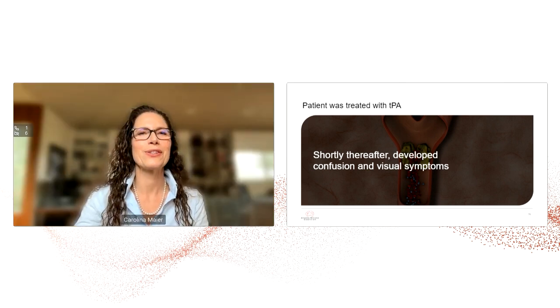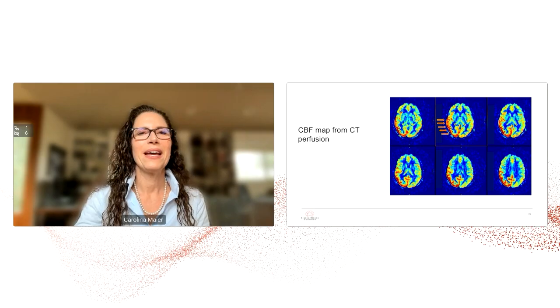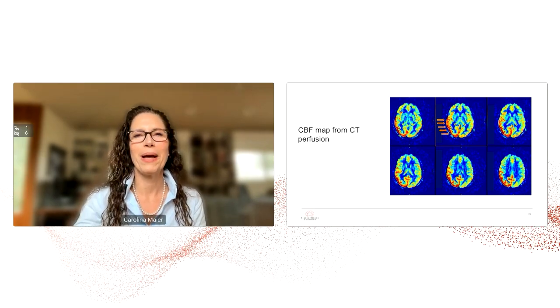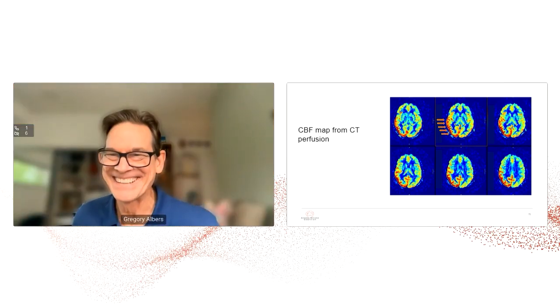So let's see what actually happened. This patient was actually treated with TPA. These are all real patients, by the way. And then here we have the CBF map from CT perfusion. I'm going to call back on Dr. Albers since he is the expert on perfusion. So Dr. Albers, can you walk us through this particular map? Absolutely. Hopefully you can still hear me. Yes, yes.